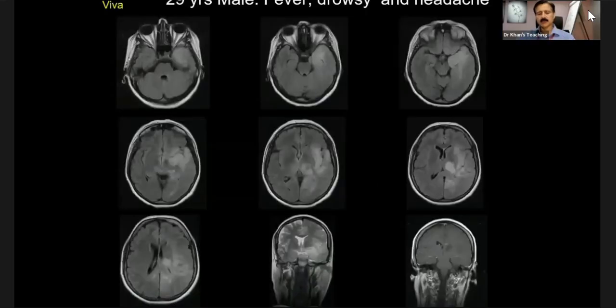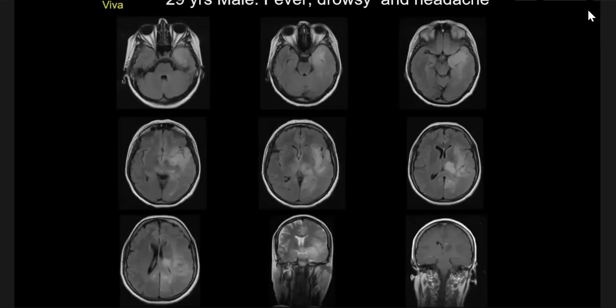Spot diagnosis. Hello. Yes, candidate 3, can you hear me? Yes, I do. So this is a very easy case, but I just wanted to include it for completion. What is your diagnosis? Herpes encephalitis.